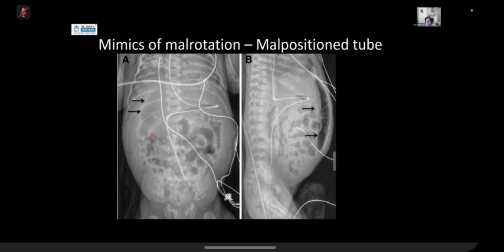Okay, so other things you think about, you can also have something like a big renal mass that's displacing your DJ flexure, which I haven't shown here, of course. And if you've got scoliosis, your DJ flexure position can also change. So remember, even though on a fluoroscopic study the DJ flexure looks malpositioned, there can be other reasons to cause it. And ultrasound is often quite helpful to exclude other causes.